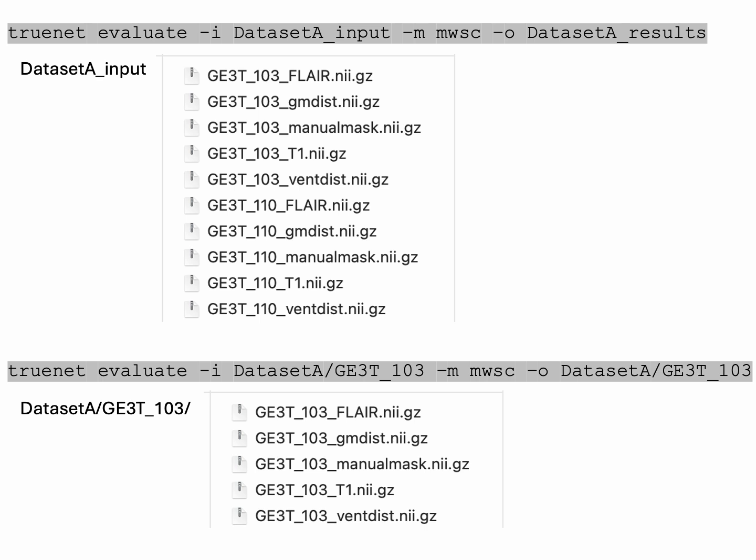It's very handy for training, especially because in evaluate you can also have individual subject folders as well, like what we see here, right? So here dataset A and the subject name, you can see only the files related to that particular subject is available here, right? So you can give either way. When you give for training, it is recommended to put all the subjects just in one folder, so it actually takes all the subjects for training and loops through it.